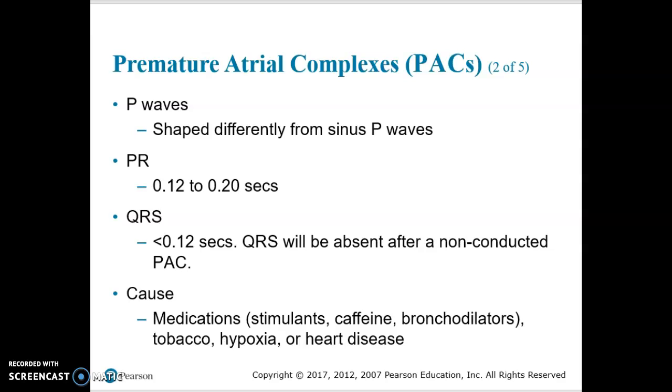The most common cause of an unexplained pause is a non-conducted PAC. Oftentimes when you see a pause on the strip, it is caused by a PAC that did not conduct. It fired early and the ventricles couldn't take it, so you don't see that QRS. Instead you have a pause.